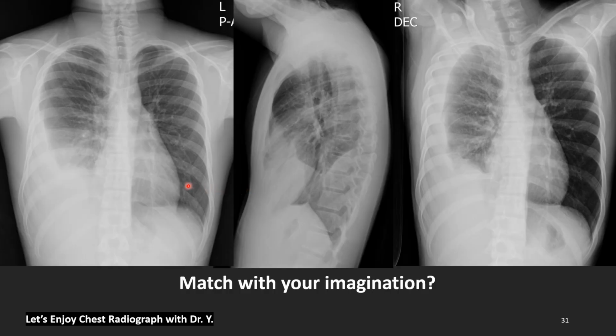Please look at these three films. At first, we imagined and drew the picture of right side pleural effusion. After looking at these films and comparing with what you have imagined, did that match? Does it concur with your picture?